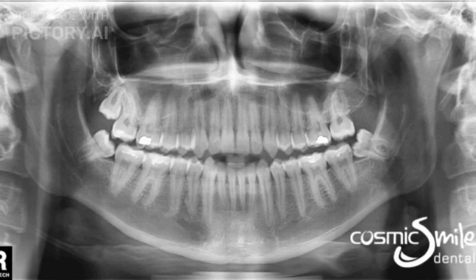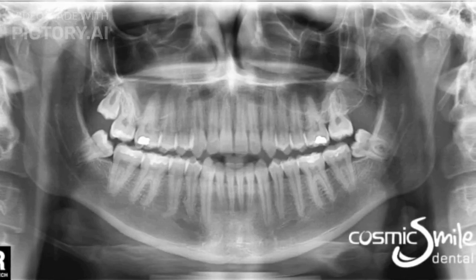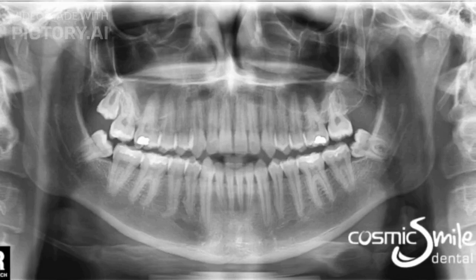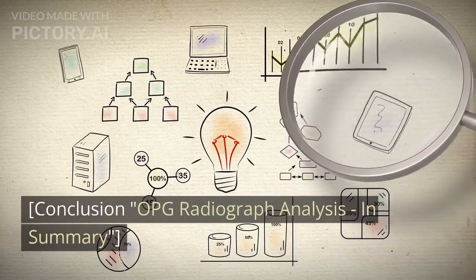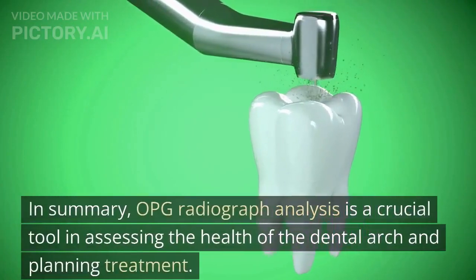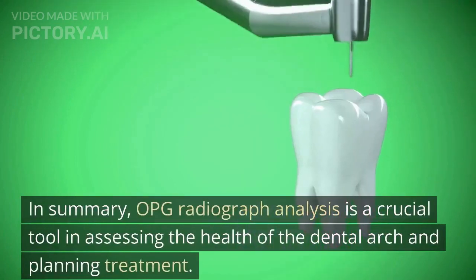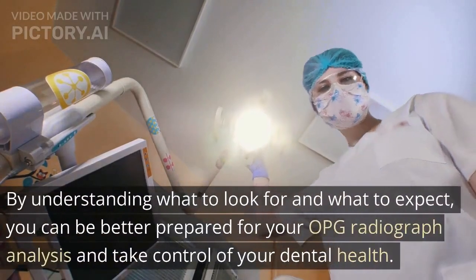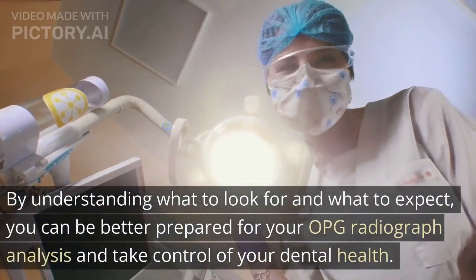Then start with the simpler things. You can identify the difference between hard and soft tissues. Obviously in a radiograph soft tissues can't be visible, but you can identify hard tissues. You can start with 4 quadrants, dividing the OPG into 4 quadrants, upper 2 and lower 2, and then comes the number of teeth, how many teeth are present in the oral cavity. On a radiograph you can clearly see the number of missing teeth, and you can get a rough idea of the age of the patient.